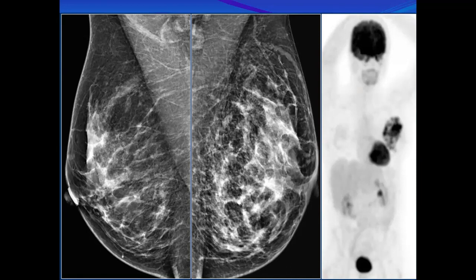This one doesn't show significant enlargement, more or less the same size, but gives these edematous changes. But you might see a global asymmetry associated with an enlarged ipsilateral breast, and in other patients global asymmetry associated with a smaller breast. Which one is suspicious?